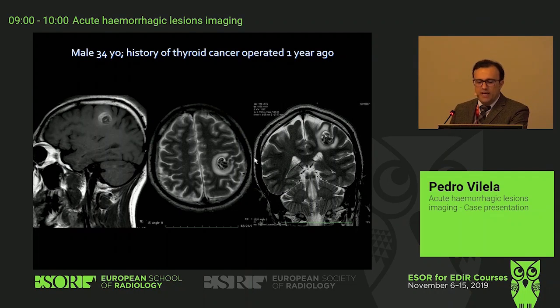Okay, so we have a lesion that explains the symptoms. So this is the motor strip here, the frontal. So here it is, and he has a hemiparesis because he has a lesion there. So the lesion is heterogeneous, right? Associated with edema. Has high and low T1, high and low T2 signal. Okay?